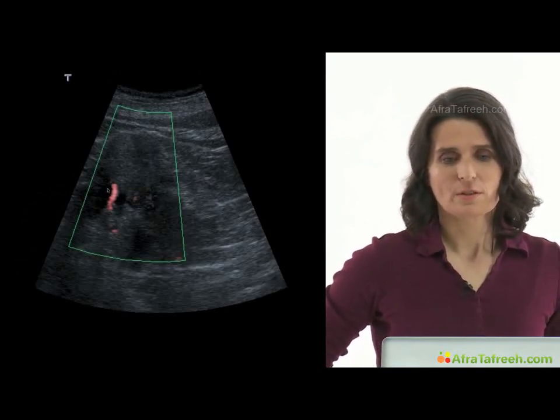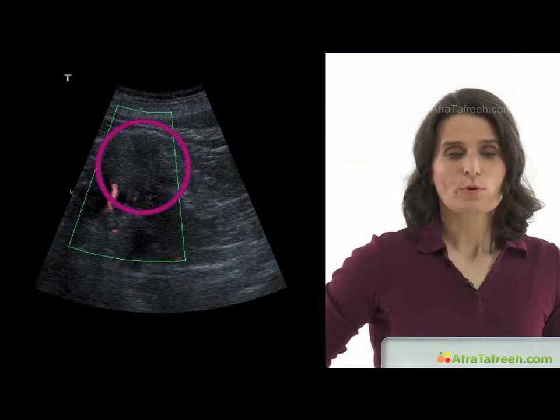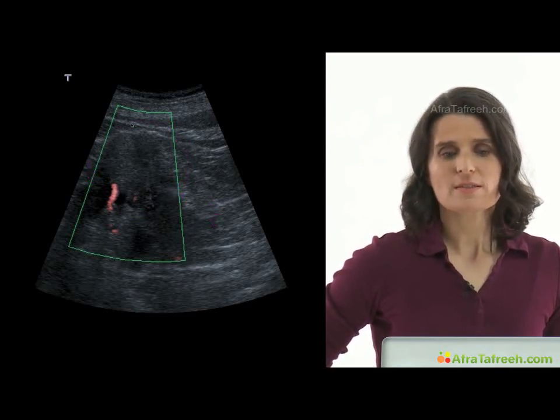In this picture, not so easy to distinguish, in the beginning here, the kidney, the parenchyma, the renal pelvis in the middle. This is also a Doppler signal. And this round lesion is protruding the renal border. Here's the normal renal border. And this big tumor is exceeding the renal capsule.